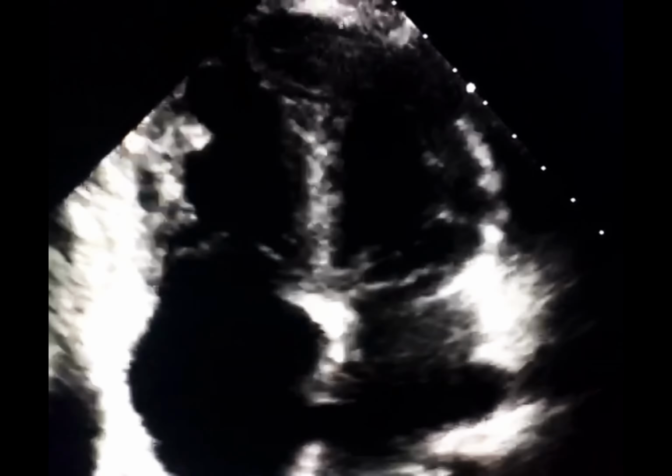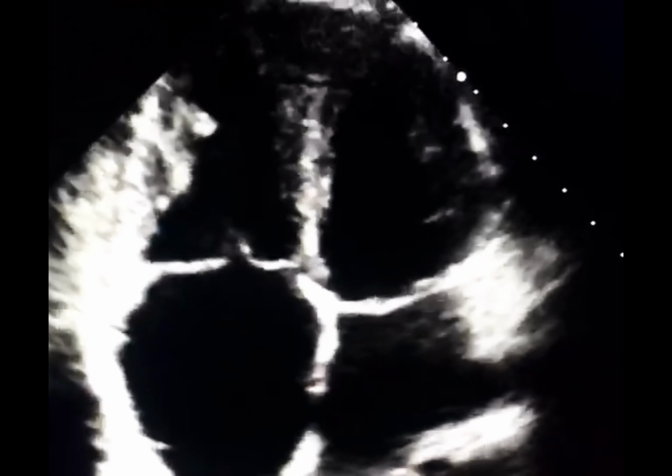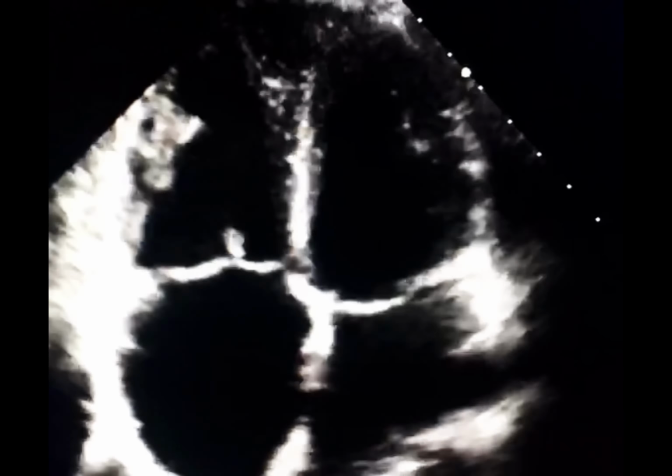Echo dropout often occurs when ultrasound waves are parallel to the septum, leading to image loss, most commonly at the fossa ovalis, where the septum is very thin. It usually mimics an ASD, but contrast study and multiple imaging planes help differentiate it.